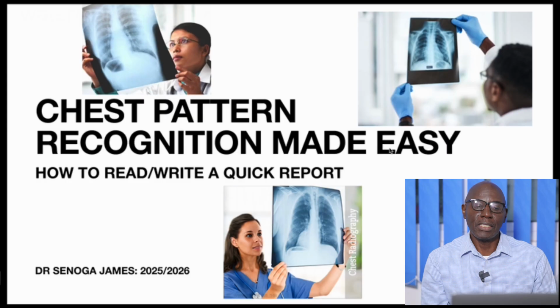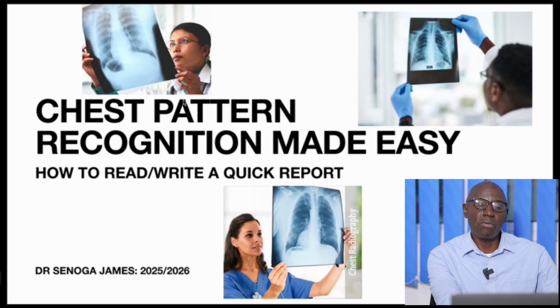The presentation today is titled Chest Pattern Recognition Made Easy. Here I'm going to be mainly looking at a chest X-ray. As you can see in those images, we are all tempted to put it up like you see on the screen there.